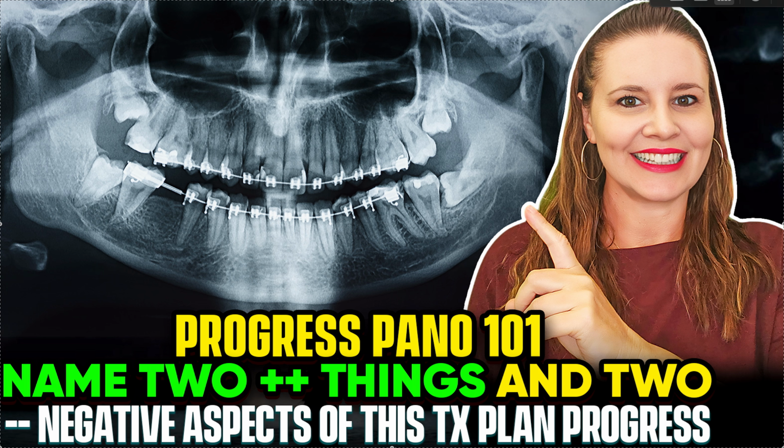Let's do it. So let's just say I know nothing about this patient, and this happens all the time, that a pano is going to come in, it's a transfer patient, or it's a new patient who maybe already has ortho on. This is going to happen to you even if you're doing ortho in a GP or pediatric office. People are going to transfer. Maybe they're looking for an orthodontist, or maybe they're transferring for their GP care, but they want to know if you do it. Will you take this case?